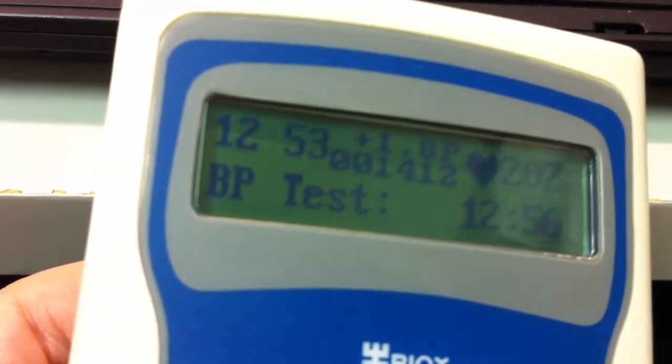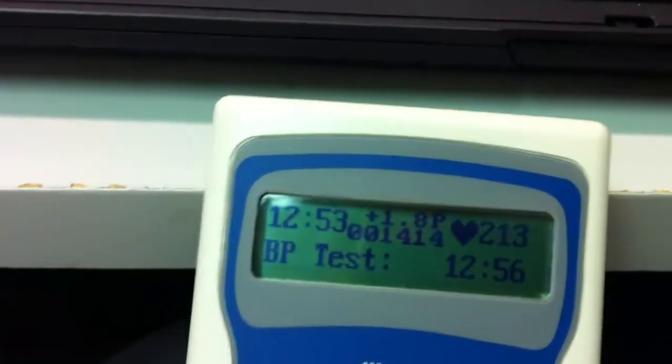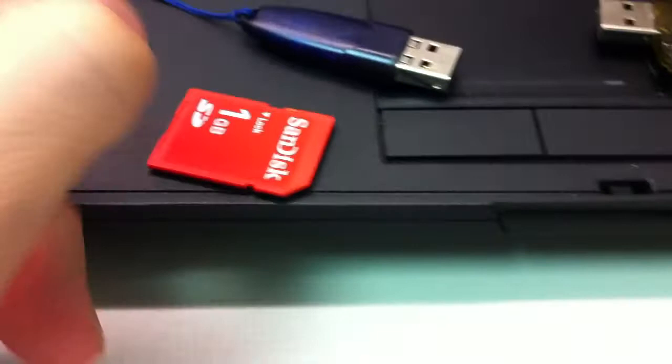When it's time for the patient to return and to retrieve the data from the SD card, eject the SD card by pushing on it gently and withdrawing it from the recorder. The SD card then will be inserted into the USB card reader. Like so.